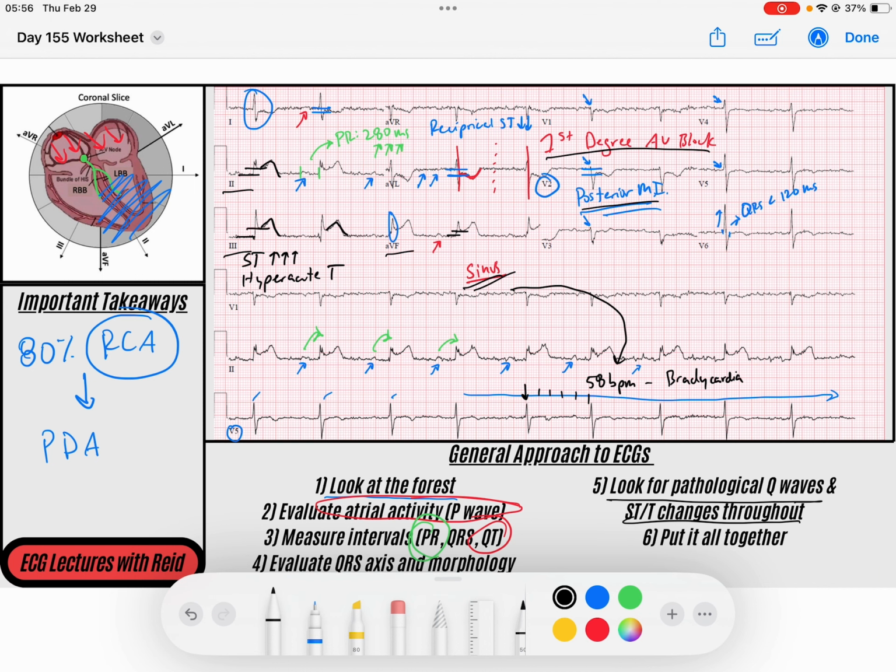So hope this helps. This person was taken to the cath lab and received a stent in the right coronary. And if you think about what the right coronary does, it supplies the inferior and sometimes the posterior portion of the myocardium, but it also supplies the SA and the AV node, right? And so that might explain why this person's sinus bradycardia is because that SA node is kind of taking a little bit of a hit from this myocardial infarction. And maybe that first degree AV block is also some evidence that it's taken a hit. So think about the anatomy, it's pretty neat.